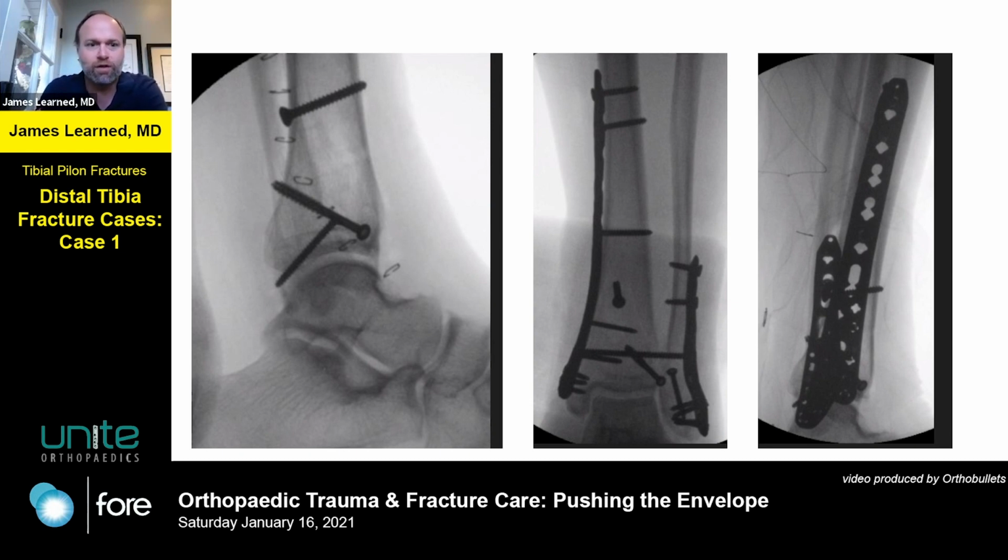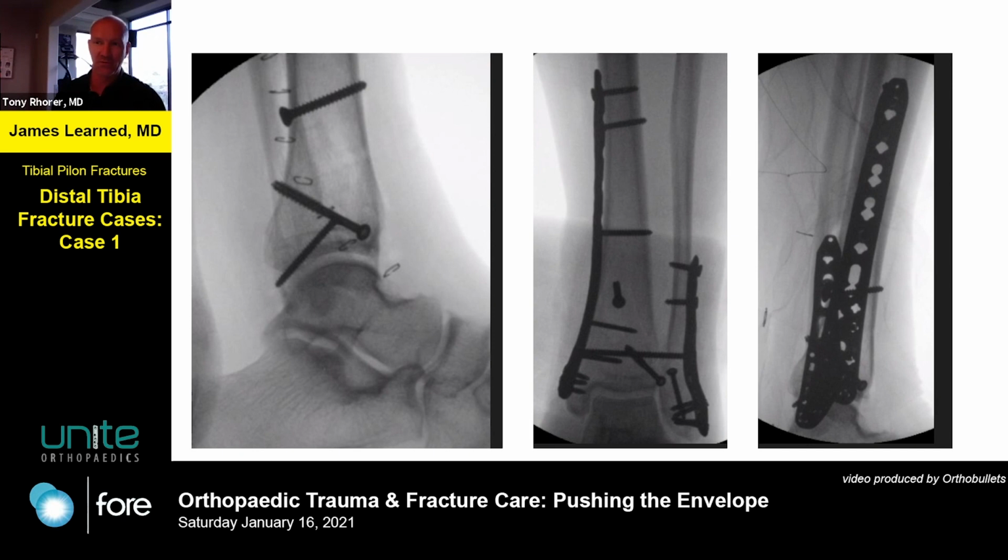And I think this, with a clamp followed by a lag screw, would be a pretty stable reduction in the back, because you've got large surfaces and a nice apical point that you can get things to really become stable. I love your comment about the anxiety of the medial plate, because the other thing I was going to ask you is, why not an anterolateral plate for this one, especially when there's a Chaput's tubercle fracture? That's usually the direction that I lean in.